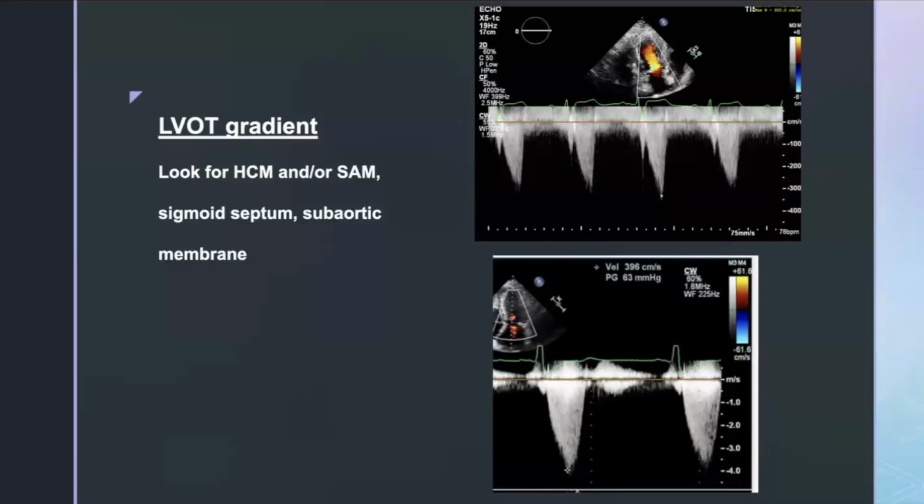And as Eamon has commented, and I hope you don't mind, guys, as you give comments I'm just including them so everyone can see. But exactly as Eamon said, subaortic membrane usually results in a fixed obstruction, so the CW will not be dagger shaped. And what I would advocate is that even if you check it and it's not high, just capture an image so that we know you have checked it, because you do so many scans a day, you're so busy, it's hard for us to come find you and take you away. So if you check it and you document it, when we read, we go, okay, we know they looked for this, it's not LVOT, it's something else.